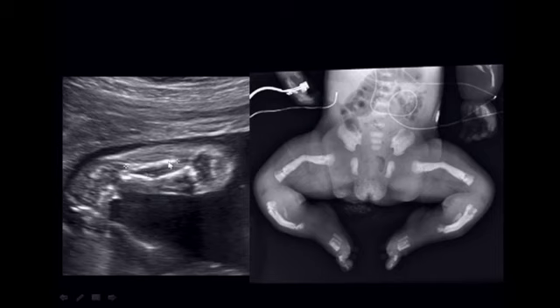You can see that it's not a nice white, sharp, linear interface with shadowing from it. And there is some angulation and distortion of the bones. But in comparison to osteogenesis imperfecta, for example, there will not be that ribbed, beaded appearance and the marked intensity of fractures in every bone. And here's an example of the angulation of the femur and tib fib in a radiograph of this case when the infant was born.